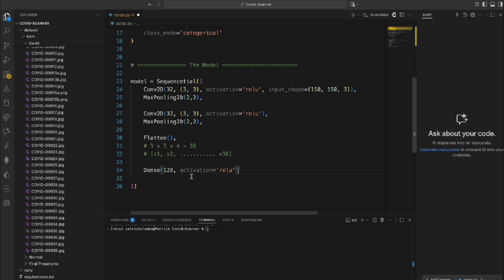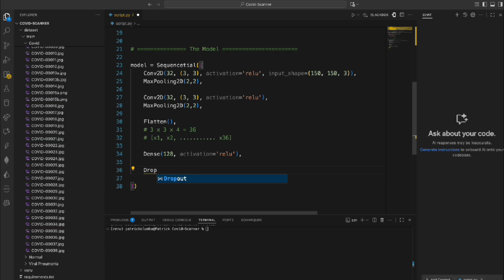And we're going to add a dropout here, and I'm going to explain what dropout means. In that dropout we're going to pass one parameter. Some of you might be wondering what dropout is. What dropout does is randomly turn off 50% of the neurons during training. The 0.5 we put there is the 50%. If I put in 0.6, that would be 60%, but I just want to turn off 50% of the neurons during training.